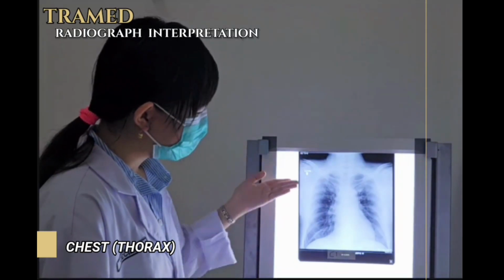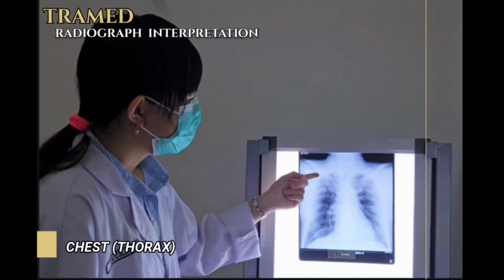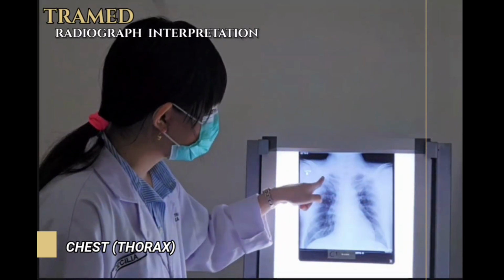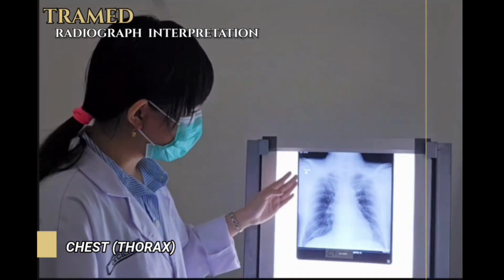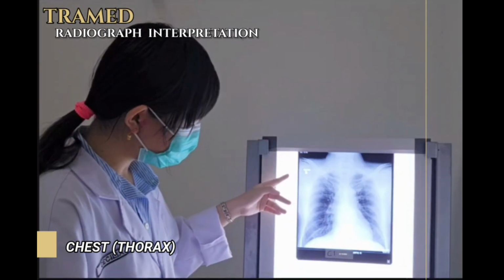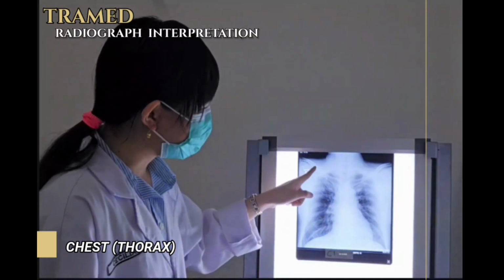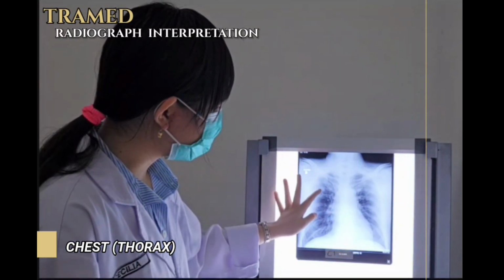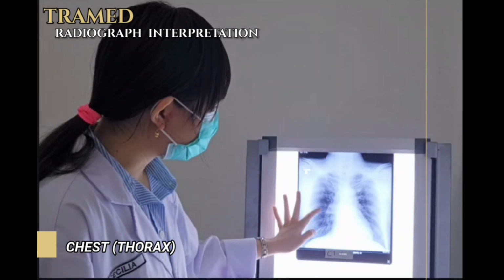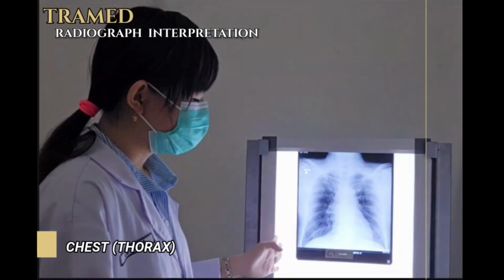The bones are intact, there is no fracture. If we look at the clavicle bone, yes. And for the next, we can look at the patient's inspiration based on the part of the bone. 1, 2, 3, 4, 5, 6 is normal.